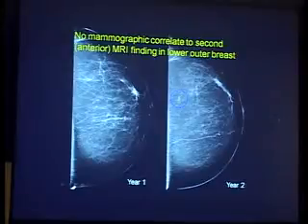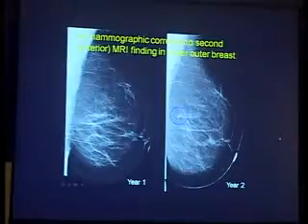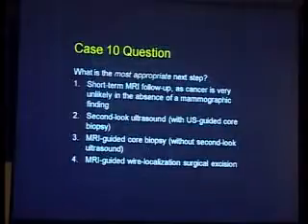Okay, I'm going to show you. Is there a lot of change here? I don't think so. I mean, prospectively, we didn't see it, and we did see the posterior one. We didn't think there was a lot of change. And is there a lot of change from year 1 to year 2? Not something I would say, but it's so dramatic on the MR. I know some of you may disagree, but again, I'm trying to not just say, look at this, but kind of go through real-life settings with you that hopefully are useful to you when you go to the clinic.